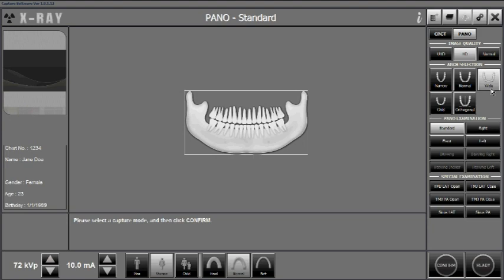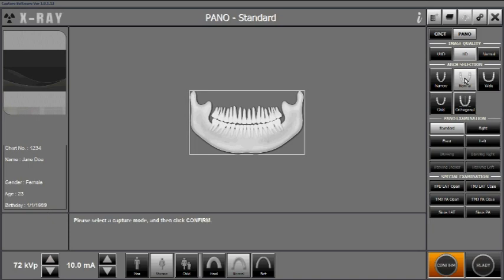This will then change the angle of the propagation of the X-ray tube to avoid overlapping of the teeth between the anterior and premolar region. A vast majority of your patients, however, will be applied to normal. So it's recommended to look at each patient on a patient-by-patient basis to determine whether they may fall under narrow, or wide, or normal.